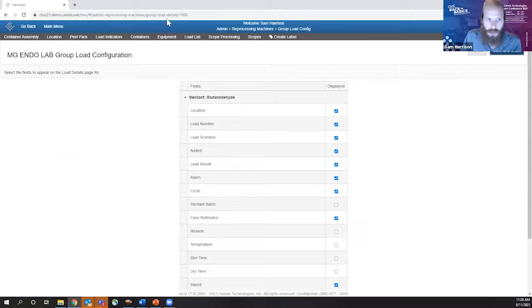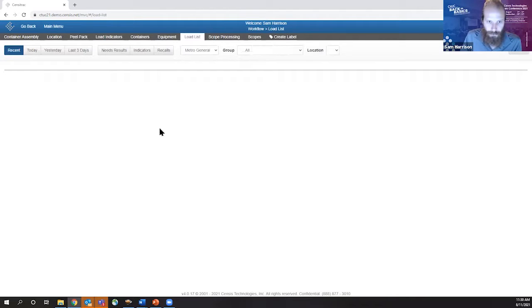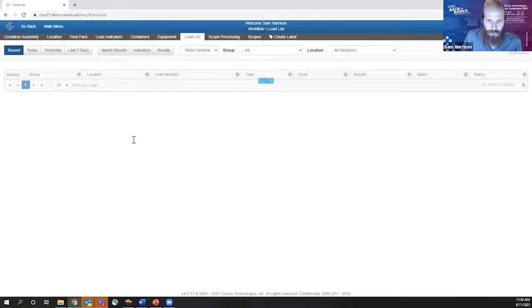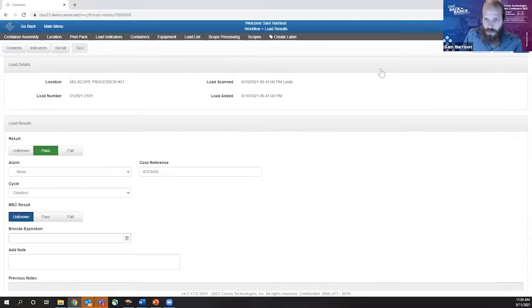Now when I go back and look at one of those loads, there's that case reference field. I don't know what a case reference would be, so let's just say first initial of last name and then 1, 2, 3, 4, 5, 6. And then we save that. I think the question was, can you run a report on that? Yes, you can, or you should be able to.